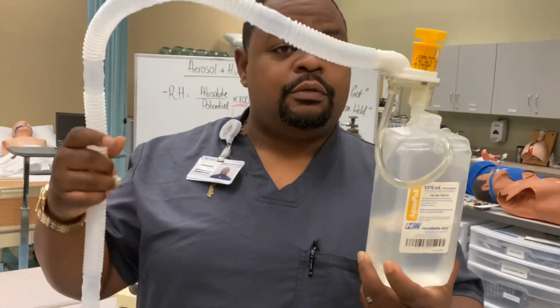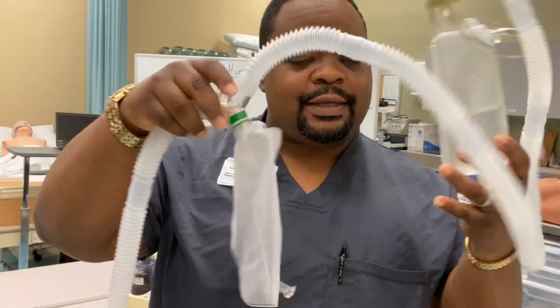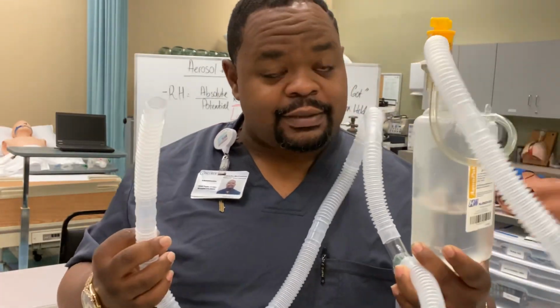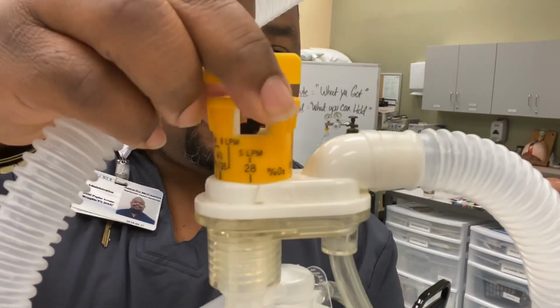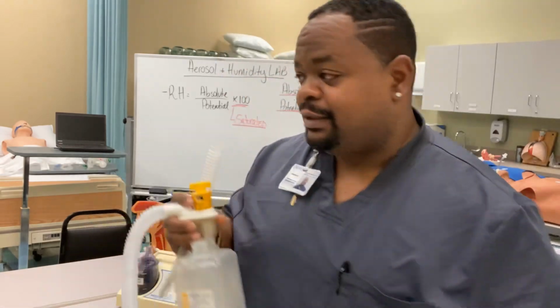They use the large volume nebulizer with one large bore tubing, then our drainage bag, and then another large bore tubing, right? And then whatever you put at the end is what we call the device. Also, remember that it uses the Venturi principle, where I can open up the vanes and windows to see what FiO2 I'm giving the patient. So this is aerosol, right? Aerosol you can see, humidity you cannot see.